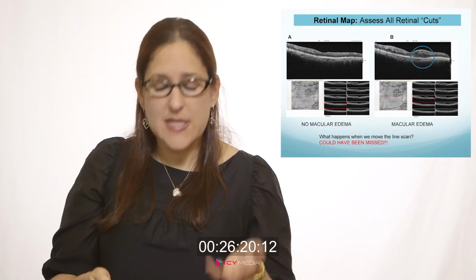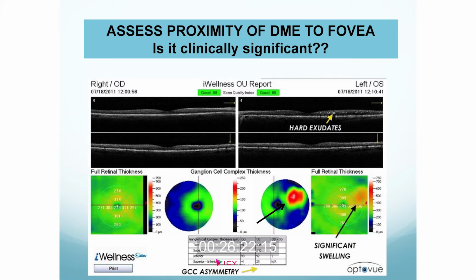It's a dynamic technology. Looking at this image here, what else can these eye wellness scans show us? We mentioned this much earlier: is there diabetic macular edema? And this is something we're going to hone in on when we get these specialized scans.